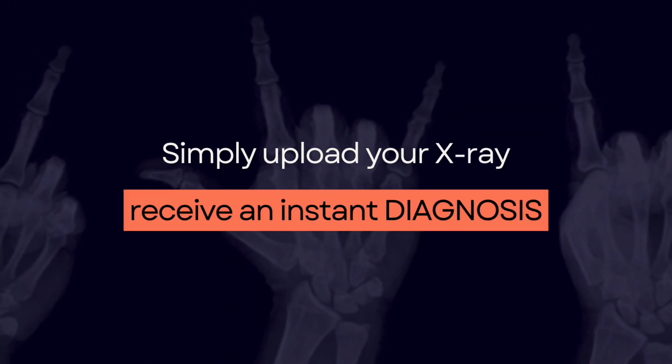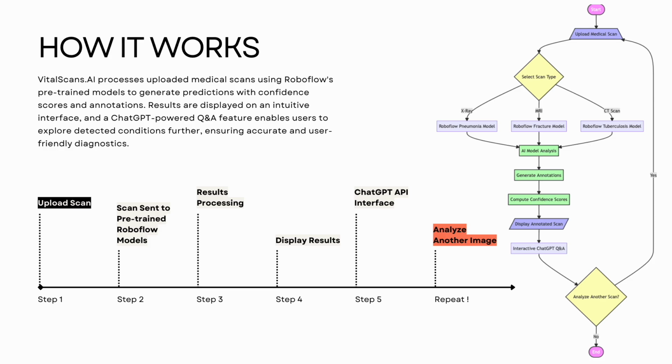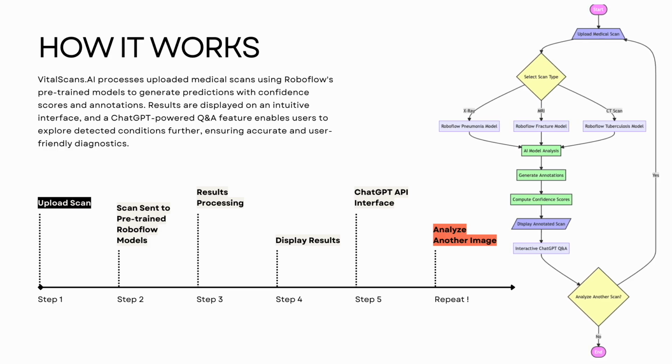Simply put, with VitalScans.AI, you can upload your X-ray and get instant diagnosis. It is that straightforward. No waiting, no delays. You just upload your scan and get the results ready in seconds. Now, let us take a look at how the app works. Imagine this. You just upload your X-ray and the app processes it using the advanced AI models that we have created, identifies any abnormalities and displays the results. You'll see visual annotations highlighting the problem areas with confidence scores for each prediction. Once that's done, you can dive deeper by asking questions about the diagnosis using the built-in Q&A system powered by generative AI.